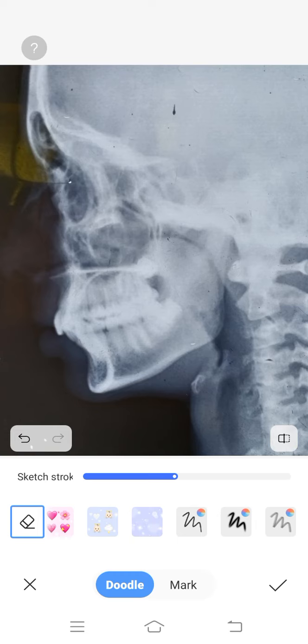So coming to this particular case, once again I repeat, this is X-ray nasopharynx, soft tissue nasopharynx lateral view, showing a soft tissue shadow in the nasopharynx hanging into the oropharynx with a crescentic air shadow. Probable diagnosis is antrochoanal polyp, the treatment of which would be functional endoscopic sinus surgery or FESS.